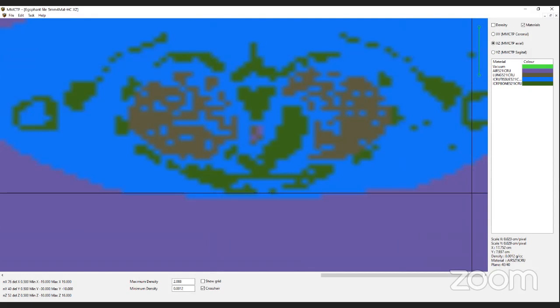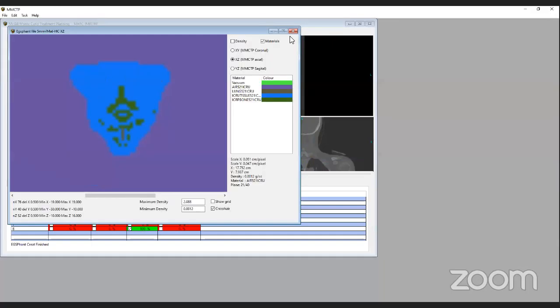Your image is inverted, right? It is, yeah. So the way the calculations work is, this is the coordinate system for DOSXYZ now. We're looking at a raw egsphant file, which is an inverted coordinate system from MMCTP.